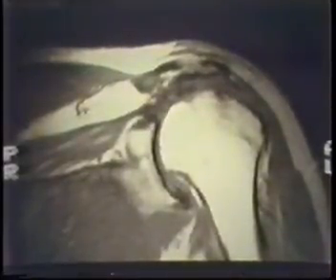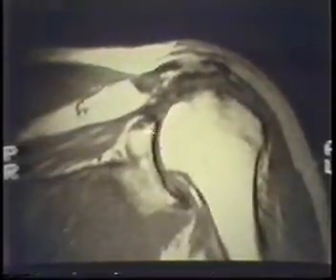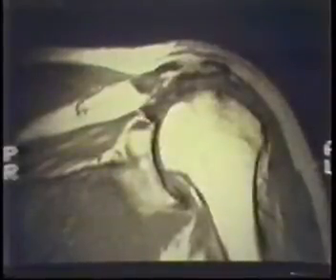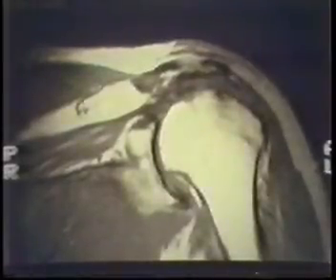Now, how do I know that more comfortably? On the T2 weighted image, if we went through all the different slices, we could see that this area is full of all high signal intensity. And the other thing is that this is just the configuration of the distal end of the muscle, how it narrows down to the tendon here. And that should be right up there. So that also lets me know that that's the tear itself. I mean, this is a huge one.